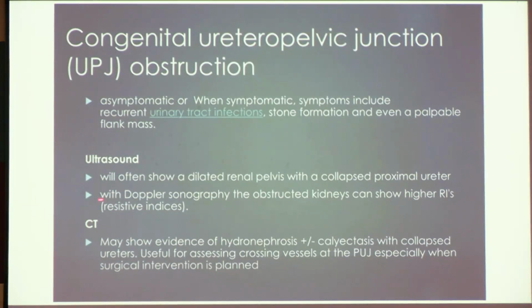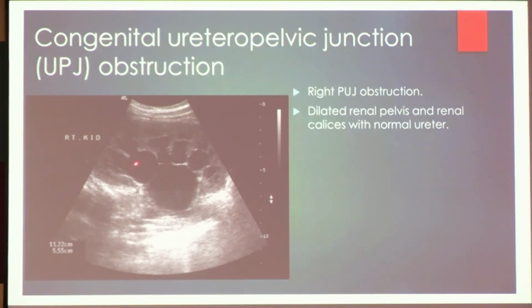As I just said, this was the IVP image I showed, but then the ultrasound is also there. In this ultrasound, as we can see, the whole pelvis has become dilated. These are the calyces which have also become dilated. Ultimately, these are the minor calyces. So when the minor calyces also become dilated, this is the cortex portion which gets compressed. So henceforth, the functional level of the kidney becomes decreased. So this is basically the last stage that comes for the UPJO.